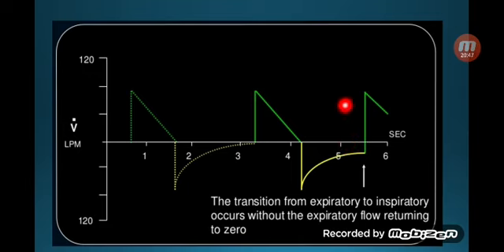So if you're setting a PIP or a peak pressure of 20, 25, let's say, and you had a PEEP of 6 initially, and then the autopeep kept being there, then ideally the pressures are adding in there, and then the delta P that you've got from the PIP that you had, which is 25, is going to be in reality different, and then the tidal volume is going to be less. Okay?